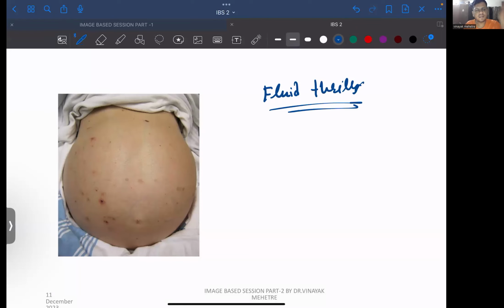What is present in abdomen? CLD patient था, liver खराब है, right? So there is going to be ascites. Patient is having पानी inside the abdomen. So what are we going to do? We are going to do ascitic tap. ascitic tap करके ये पानी हम निकालेंगे.